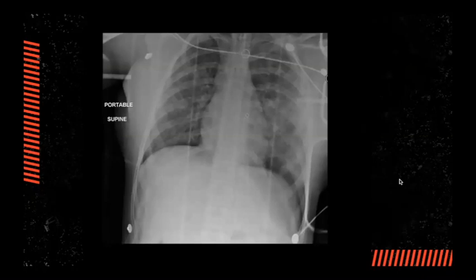All right, so this is another case, which is also a pneumothorax, which is quite subtle. As I mentioned earlier, we can't really see any pleural line here, but there is a deep sulcus sign on the left side, by which the costophrenic angle takes a deep dive down here, because of the small loculated pneumothorax. If you compare with the contralateral side, it is much more radiolucent here. So this one is basically a small left pneumothorax.